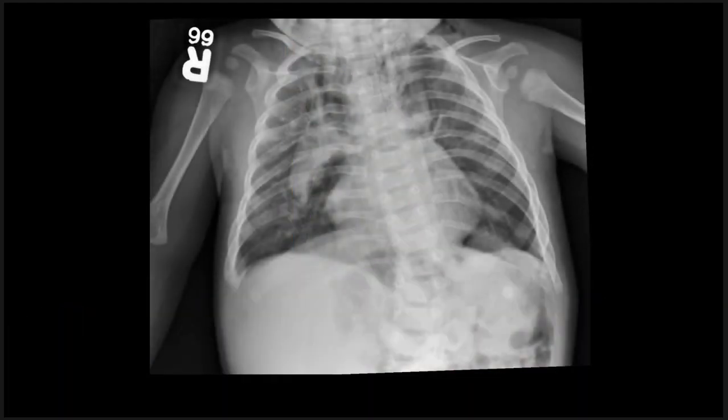So I'll bring that up because some people will say that that looks like a Spinnaker sail. Lots of different sail signs in radiology. This one right here is the Spinnaker sail sign. And what this is trying to show you is that just like on the ocean, the sail is being lifted by air.